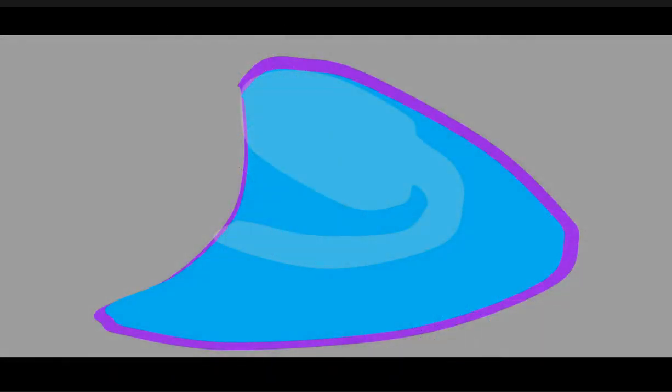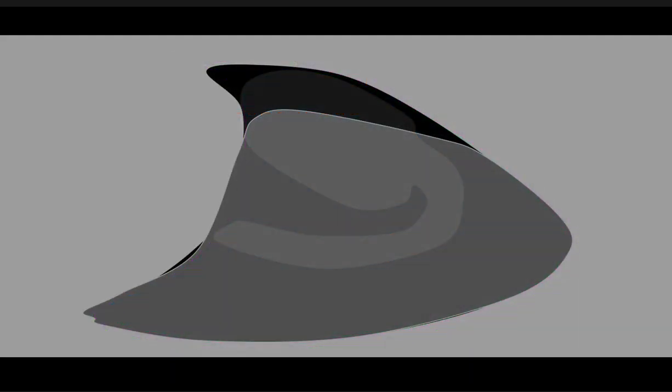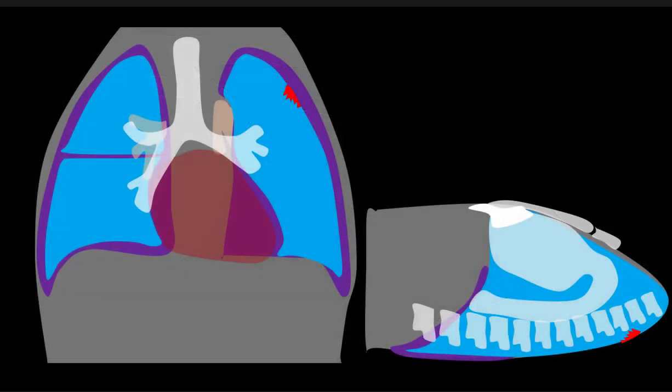When we discussed this originally in the prior lecture, I tried to make a big deal about how the highest part of the pleural space is actually at the lung base, right underneath the inferior surface of the lung. So that is where the air goes. And of course it's not colored like this, right? It's grayscale. So that's the spot we have to look.